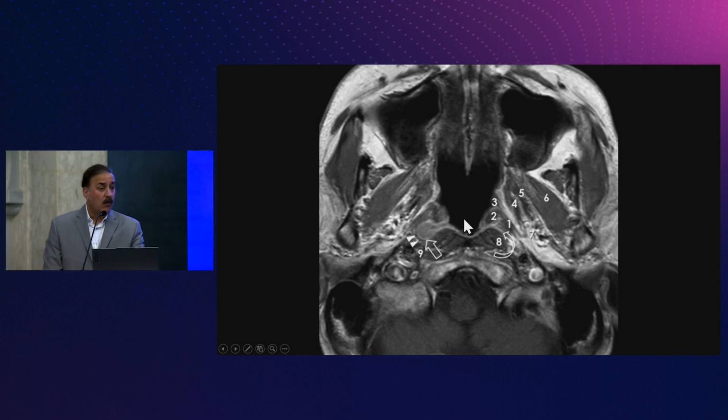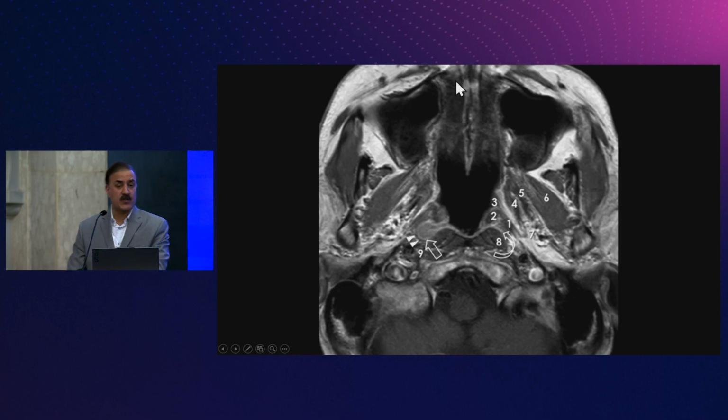What's important? Once the ENT surgeon comes in and puts a scope in through the nose and looks at the nasopharynx, they are not going to see any abnormality here, because the torus tubarius, which is over it, is going to block their view. So for nasopharyngeal carcinoma that is this small, you are responsible for picking it up, rather than relying on your ENT. When they are big, out of the nasopharynx, getting into the nasal cavity and all that, absolutely, they will see it. They don't need you to pick that up. But this is what they need you to pick up. They don't want you to miss this one.